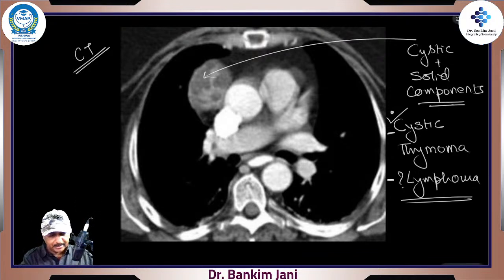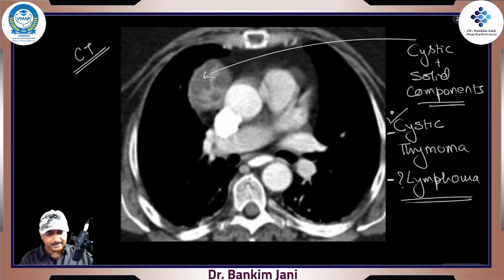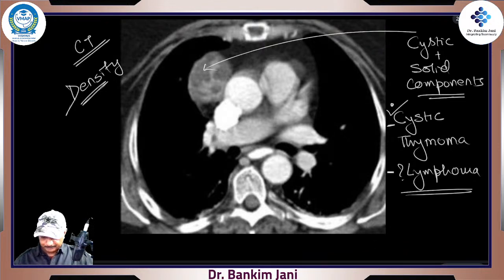There is a complete graph available, where you can watch the density. From the density which you measure digitally, electronically, with the help of that panel, you'll be able to see what it is filled with. Even if there is blood, you'll be able to figure it out. Achha.